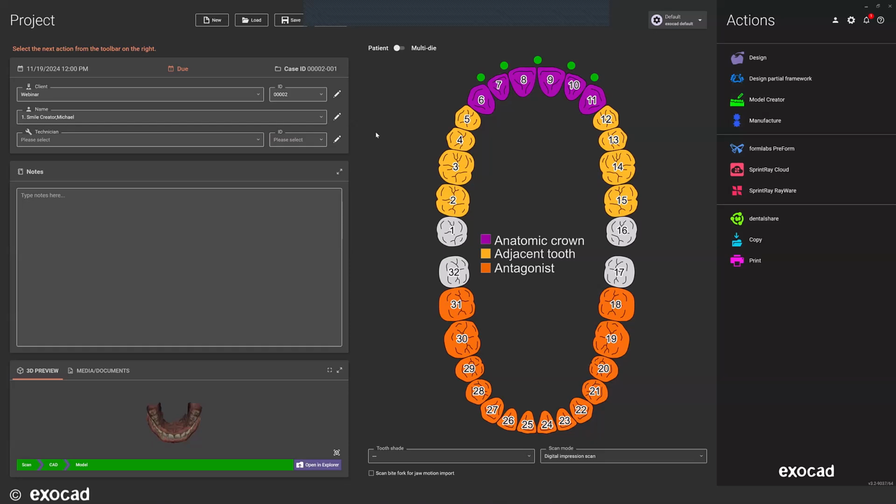One other question about the gingiva: is the extracted gingiva used instead of a created gingiva when adding to the restoration? I think they're talking about the tooth segmentation part, when it also creates that gingiva section. If I remember correctly, that does create a separate item on the show hide list for gingiva, so you can use that shape.